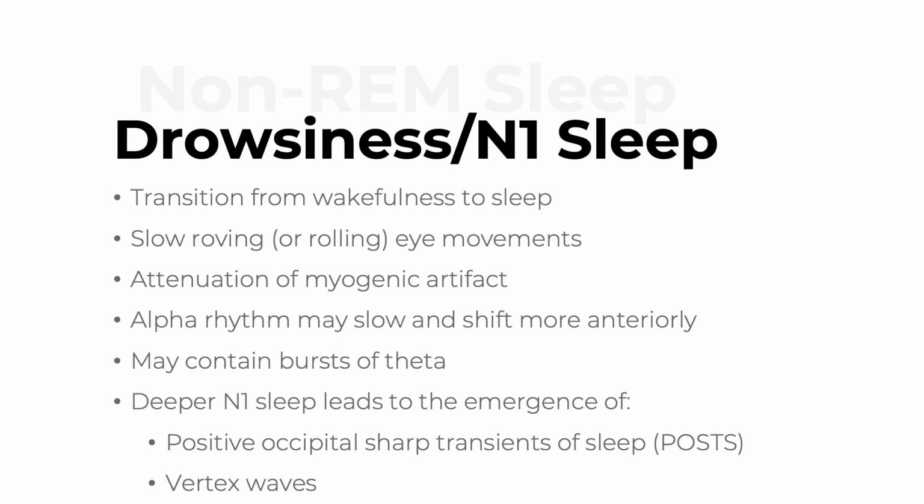You may also see some bursts of theta during this stage, and really there's kind of an artificial distinction in a lot of EEGers between drowsiness and N1 sleep. In a lot of sleep grading scales, they're just the spectrum of the same stage of N1 sleep.